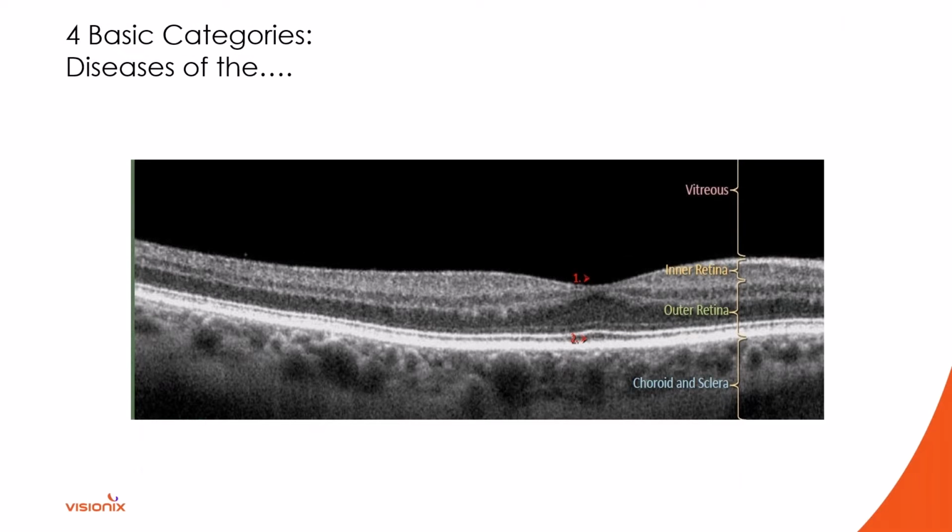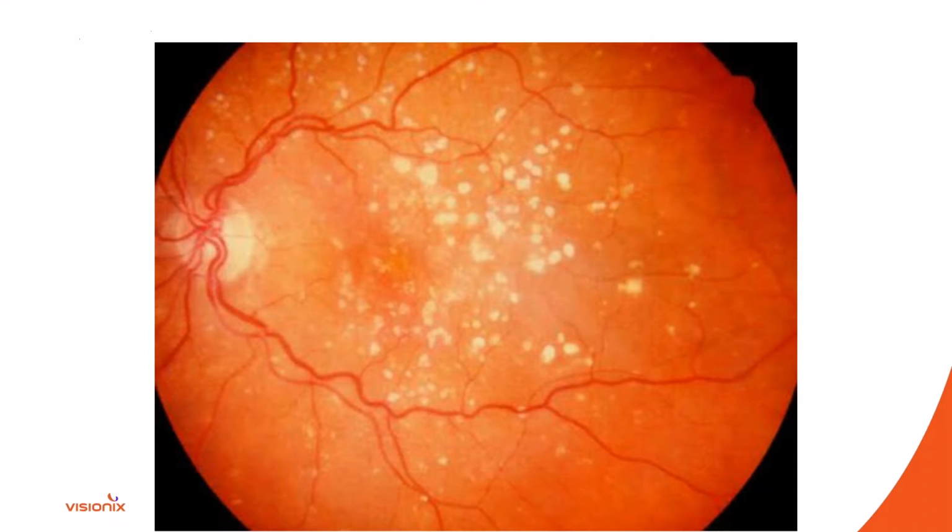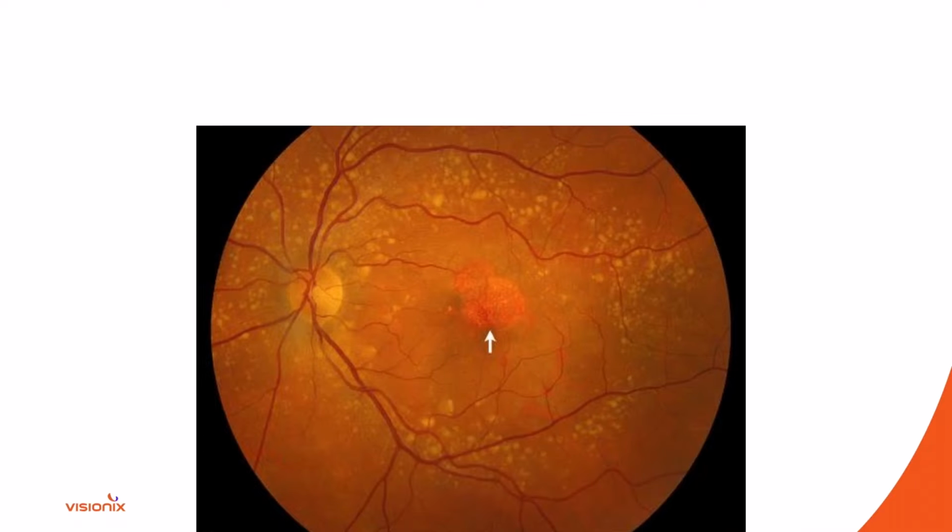There we go. Perfect. So we're going to start with just real quick, I think you need to talk on OCT, specifically in the outer retina, before we get into OCT angiography. So one of our first cases here, you just show up a picture of a fundus photo, and obviously we've got extensive drusen in the posterior pole in this particular patient there. And the question is, when you see a patient like this, and this was a 78-year-old female that's, again, got extensive drusen in the posterior pole. You can see geographic atrophy here.